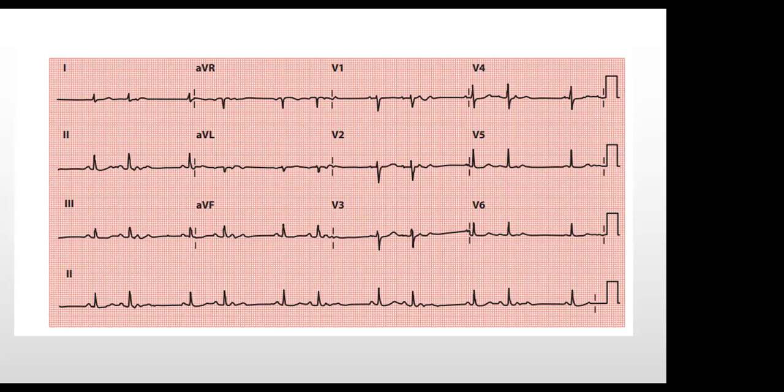The first complex on lead 2, the lowermost on the rhythm strip, and then looking at the second complex, the PR interval looks different, and also the P wave I don't think is exactly the same.